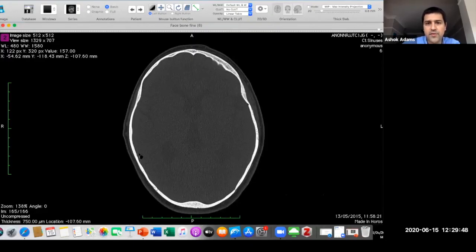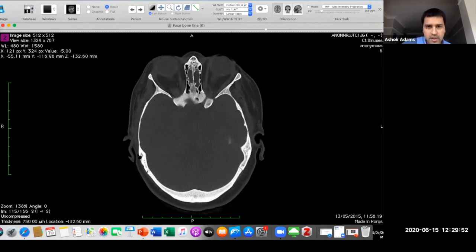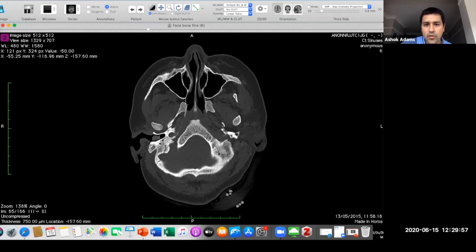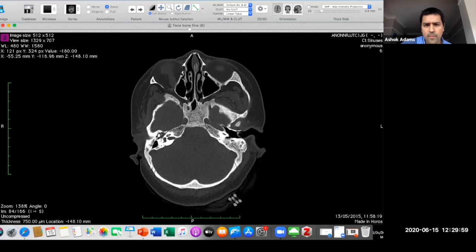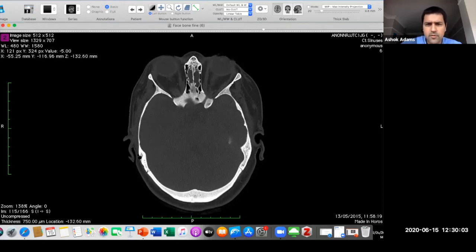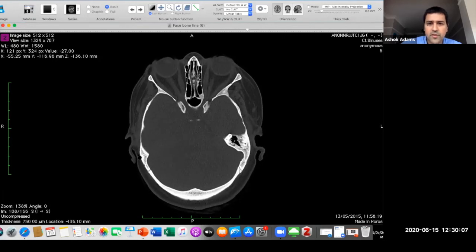So, okay, this is to recap on one of the take-home points about sphenoid sinus. So this patient had intermittent kind of nasal discharge. They'd also been seen in neurology clinic as well, I think, from what I remember. Okay, this is just to recap. So they had intermittent discharge from the right side of the nose.